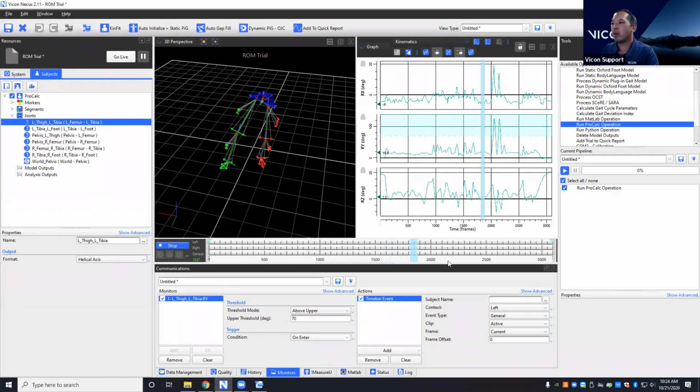70 going up, it will go ahead and put a bar here just to let me know that that's happening, right? So you can still get that kind of feedback in real time as well. So that is the advantage of updating your VSK so that you can get pretty accurate feedback in real time for your trials. So thanks for that question.